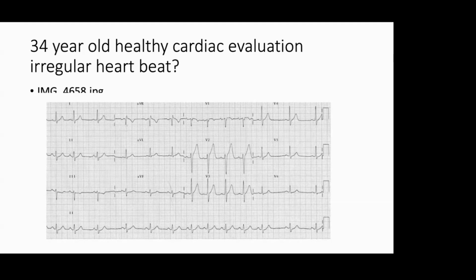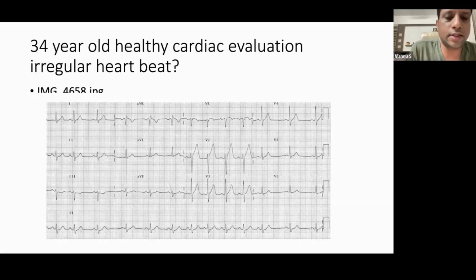So possible sinus arrhythmia. Yes. When will you tell it's sinus arrhythmia? What are the hard findings you tell about this? This is sinus arrhythmia, nothing else. Not sick sinus or sinus exit block. Usually, sinus exit block versus sinus arrhythmia is the question.